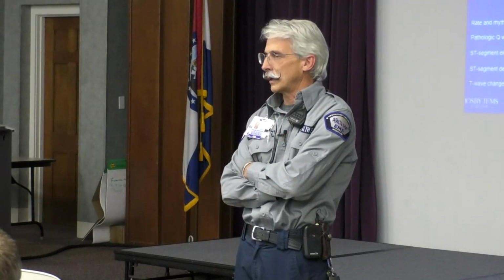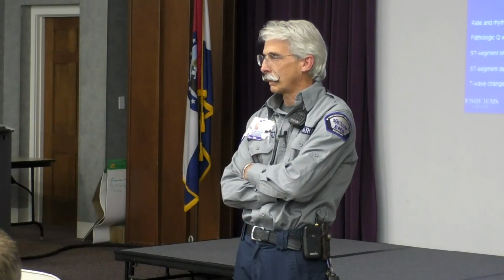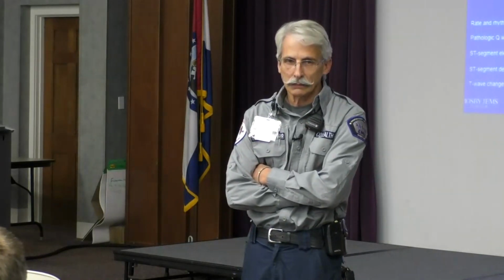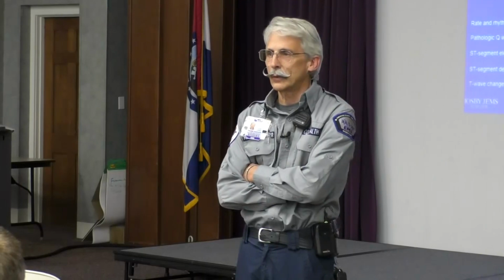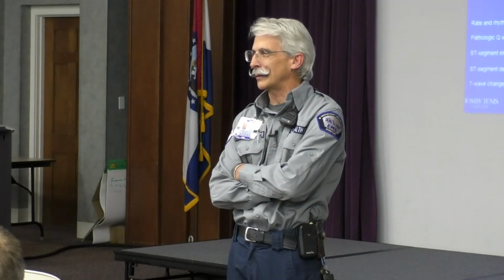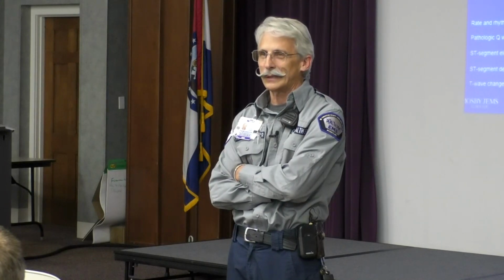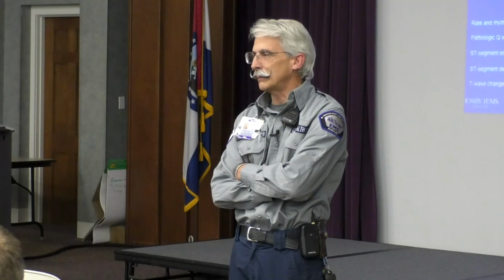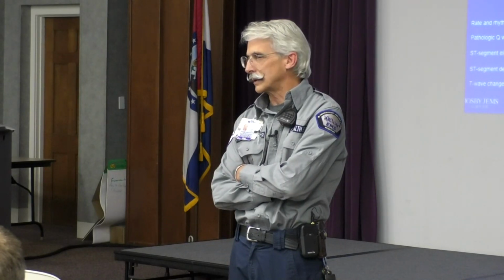What does it do to them? Not necessarily negates it, but it sure makes me question it. We used to teach that if you've got a left bundle branch block, just forget it. Just treat the patient, because it's only important in certain circumstances.